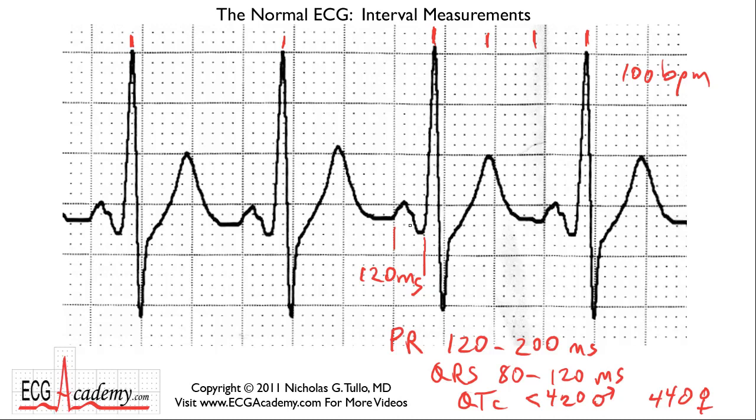The heart's going fast, so their AV conduction kind of gets enhanced that way. The QRS starts with this light line and ends right about here. So you'd call it 40, 80, and not quite another box, so that's another 20 milliseconds. That gives you 100. So 100 milliseconds for the QRS duration, that's in the normal range.